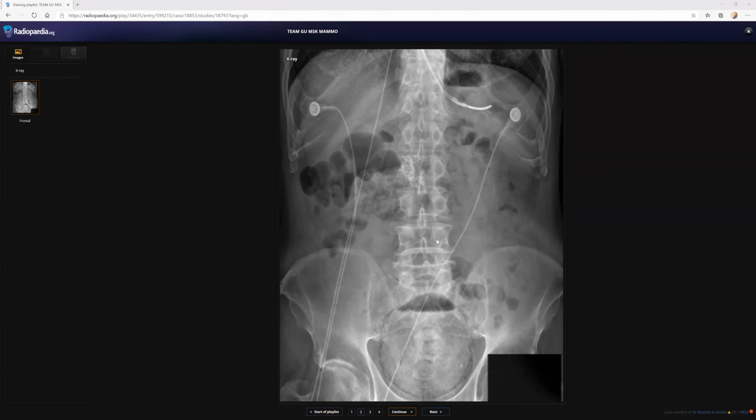So this is the plain frontal. Actually, it's saying Dr. Saneej, decline your request. I told you, I will give you the remote control whenever it is needed. You can start the examination. You can start saying. Why is the need for remote control in a plain film?